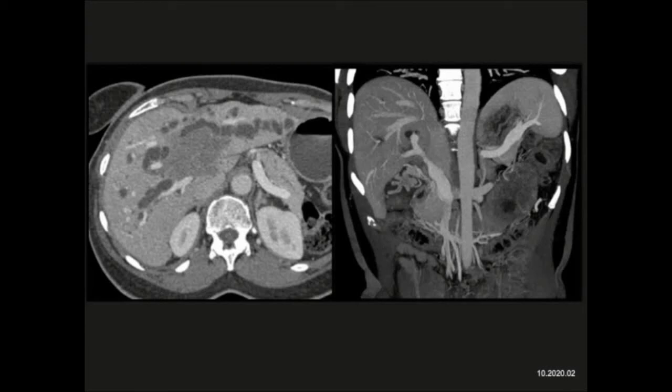Could it be hepatoma? Well, hepatoma usually doesn't give dilated ducts. Could it be a cholangiocarcinoma? It's possible. Could it be what else? Well, tumors that infiltrate into the hilum can also be lymphoma. When you look at the image on the right, the MIP image, you can see the encasement of the portal vein. It's patent, but it's narrowed. And truthfully, cholangios or lymphoma, or in fact hepatoma, can do this. So when you look at the choices, those are 3 good choices.